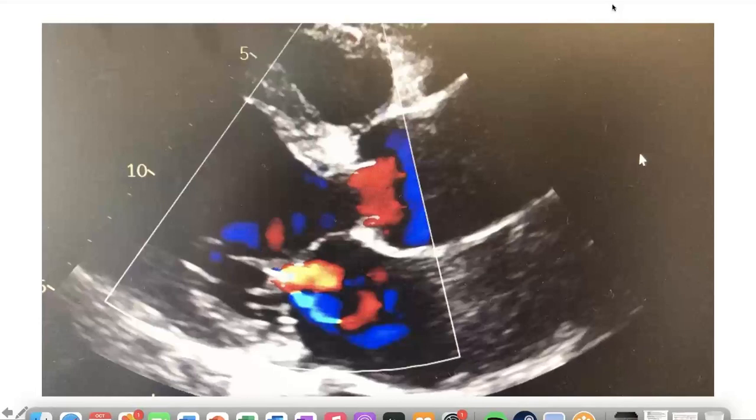And I think, so today, while we're still doing linear measurements, you probably want to measure a little more distal than the normal spot to get something that's more reflective of LV size. So when you're comparing one to another, you've got to go back and look at where they measured, because you're going to get different measurements depending on where you do that linear measurement. And this is a good example of why that might be.